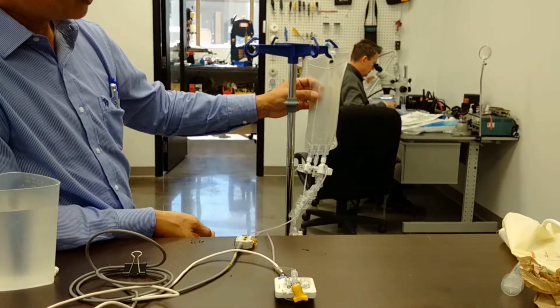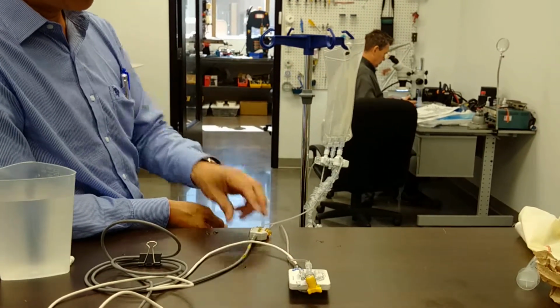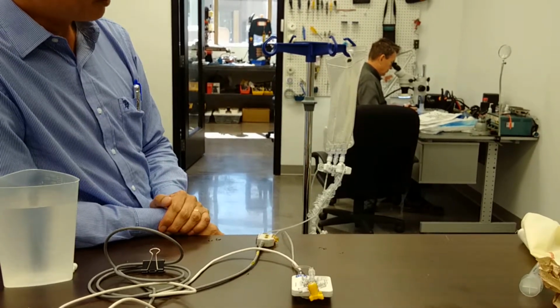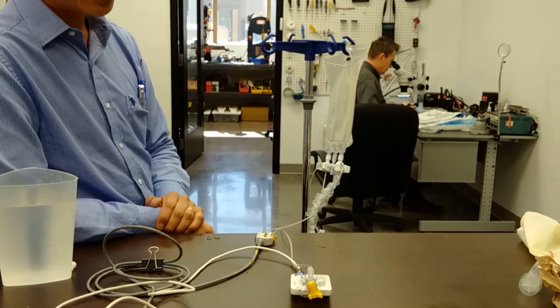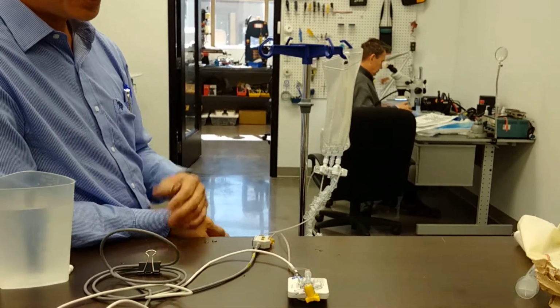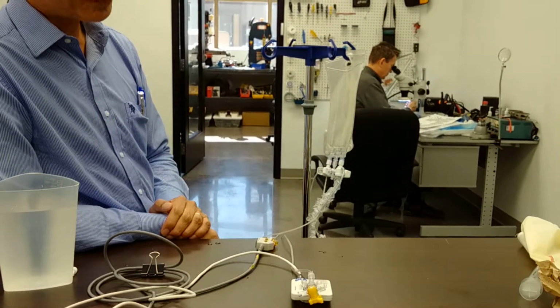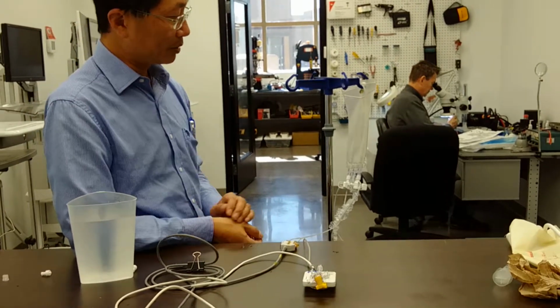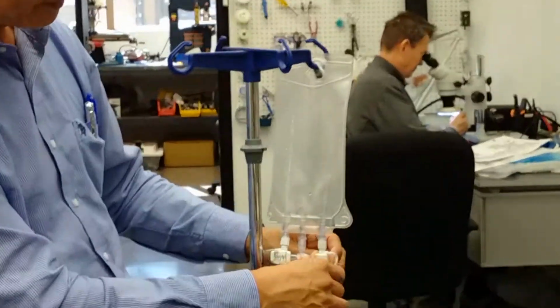In the air situation, the sensing balloon doesn't matter where it is in the rectal space. I can move it up or down, doesn't matter where this location is, doesn't matter where this is inside the bladder. So we got to understand that the behaviors are quite different, and to maintain the same kind of baseline levels, we're probably going to use the air as a reference and adjust catheter position so that the water balloon and the air balloon are about the same. In this situation, we would lower it.